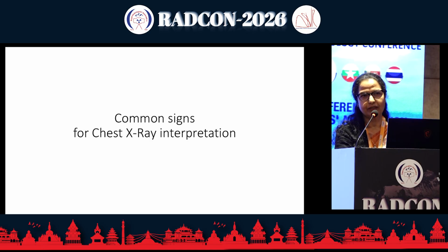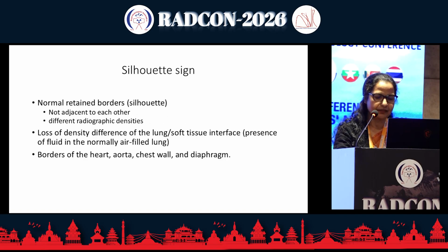Now, before interpreting the chest radiographs, there are some common signs. I have tried to incorporate most of them. If I have omitted any, I am very sorry. These signs usually help us either in localizing the pathology or sometimes in arriving at a differential or definite diagnosis. That's why these signs are applied.